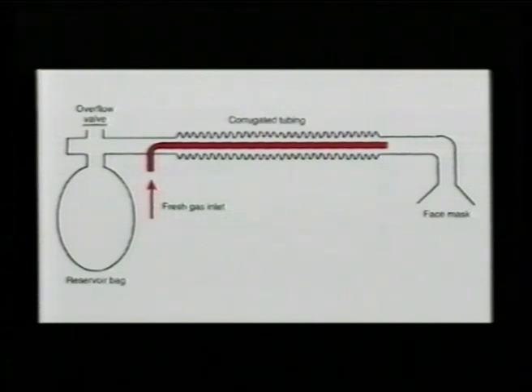Another type of one-way system is the Bain system. The inspiratory part leads through the inside of a larger tube through which the patient breathes out. The course of breathing is similar to the Mapleson systems, but at the expiratory ending there is a reservoir with a pressure valve which allows artificial lung ventilation.